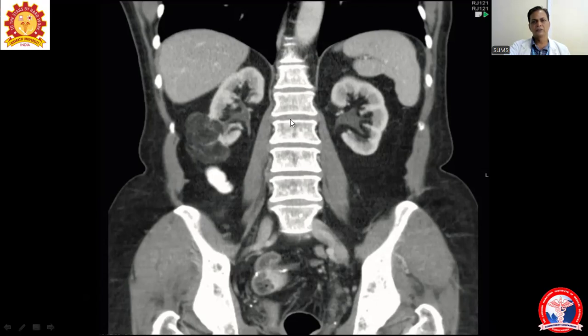We are seeing dense bone here. As you know, the density is very high because it is bony. Soft tissue is called isodense and fat is called hypodense. So here, at the lower pole of the kidney, there is some mass with well-defined margins. Little lobulations are seen. This is a well-defined, lobulated mass seen along the lower pole of the right kidney.